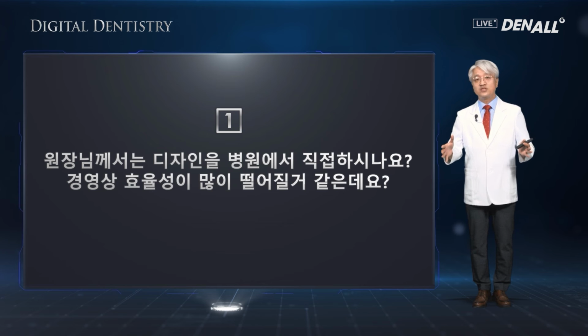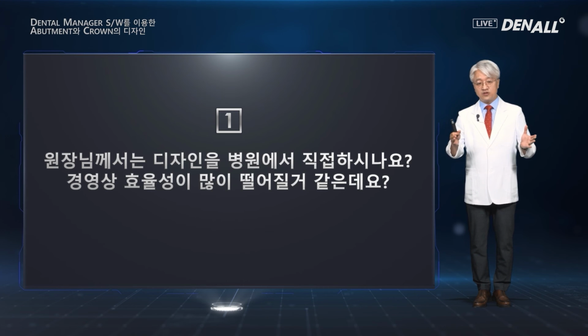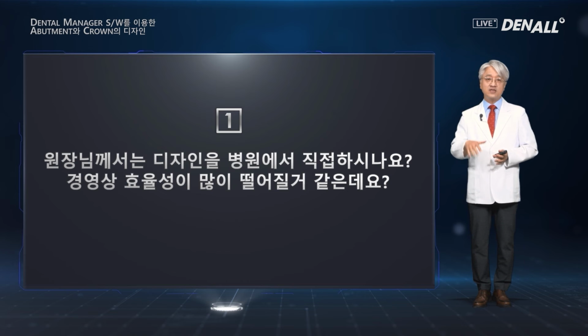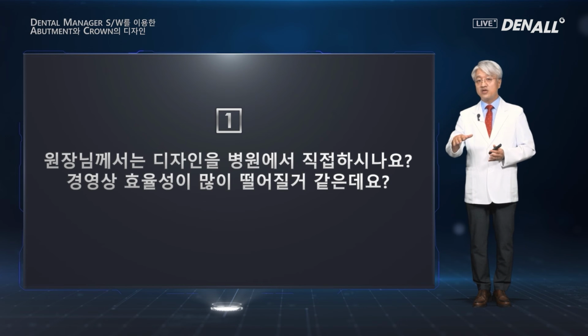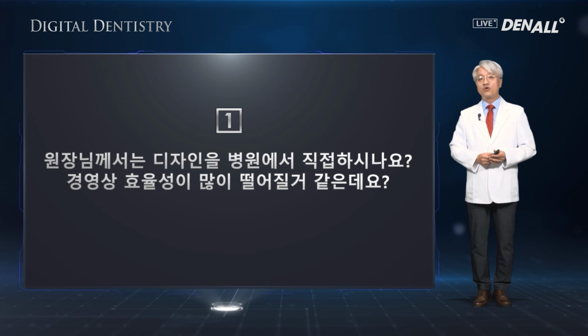You need to see patients all day long, and if you have to do the CAD work yourself, it's not very efficient. In the short-term perspective, management efficiency can be lowered. However, in terms of the clinical quality, with a long-term perspective, the management efficiency can increase. So that is the solution I use. Depending on your situation, you need to choose an appropriate solution.